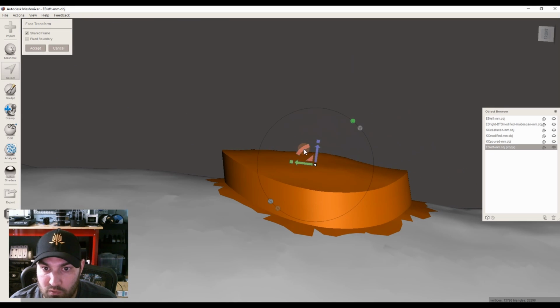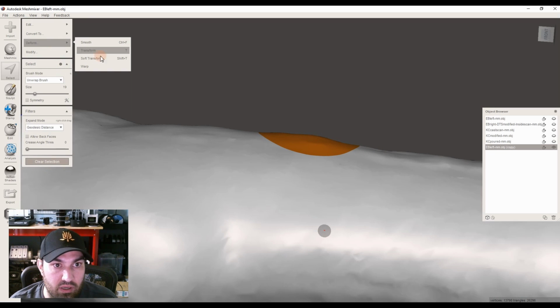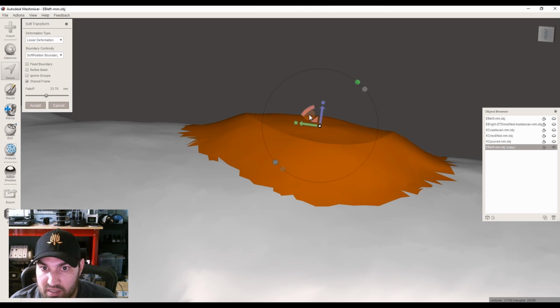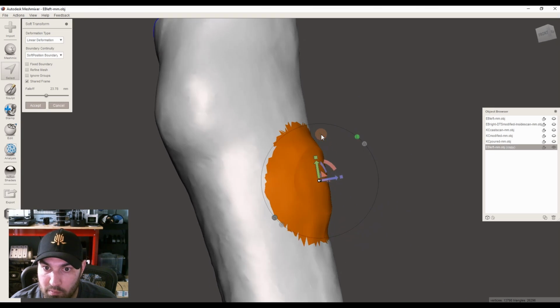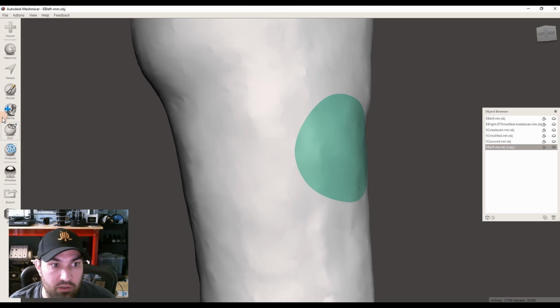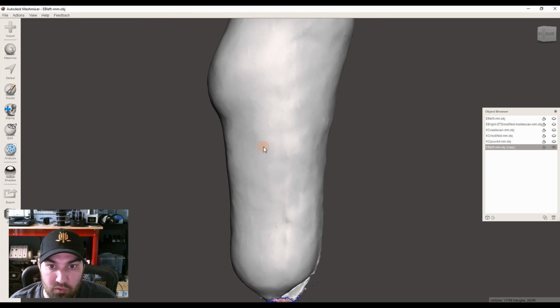When you do a transform, you can actually have a lot of control over this. And if you do it with a soft transform, you get a lot of that same control, but with pre-blended edges. So this can be a really nice way to build things up. Sometimes what you have to do is actually start small. So let's do modify and remove that face group.